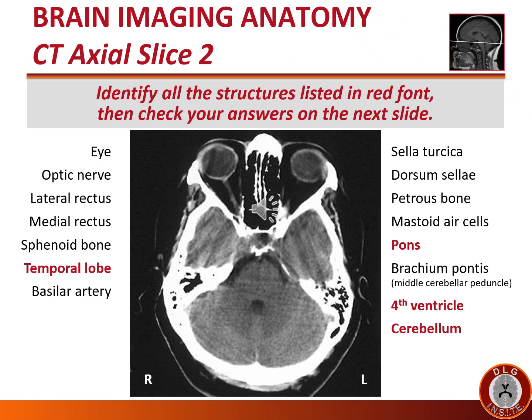We shall start with brain imaging anatomy. Please take a moment to identify all the structures listed in red font. Pause this slide and then check your answers on the next slide.